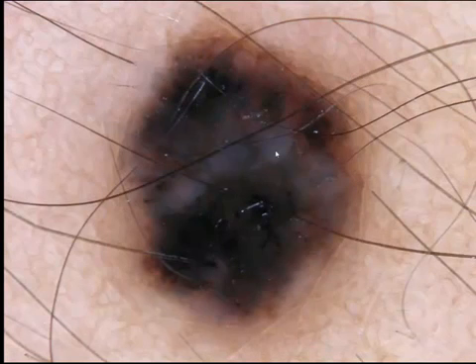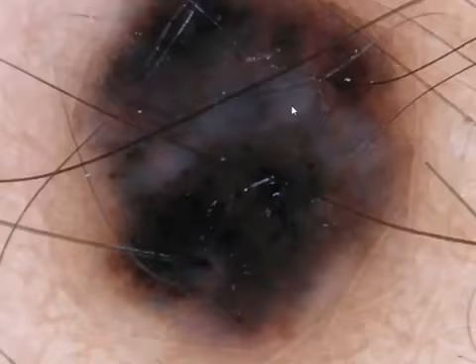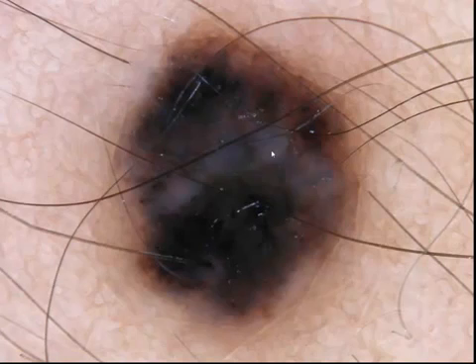Now, we have talked about the meaning of black. It could be melanin or it could be hemoglobin. Now, how should we interpret black? As melanin or as hemoglobin? Now, it depends on the context, like always. Here, black appears together with brown, so it should be interpreted as melanin. If black appears together with red, it should be interpreted as a hemorrhage or hemoglobin. In this case, of course, it's melanin, which makes it advisable to excise this lesion. This is not a melanoma, it's a congenital nevus, but it could be a melanoma as well. There is no way to tell the difference.